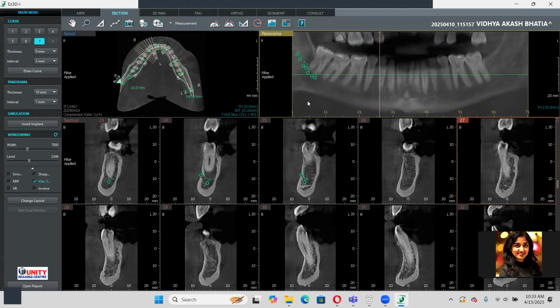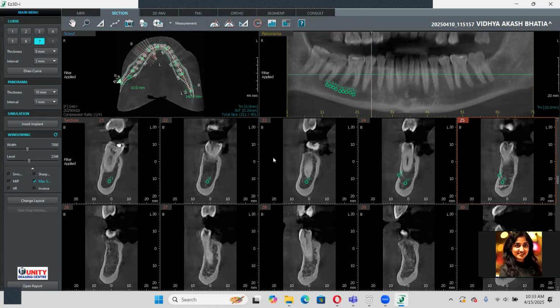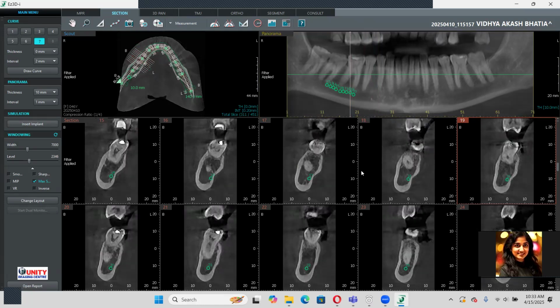Now, since we have put that edit, we can check again. It's not much, but if you feel, you can make a little bit of change, like a little downwards, but it's very minimal, zero point 0.1 mm kind of. But in the slices, it is confirmed that it's within the hole itself. So yes, the canal's course is never straight. So it's fine. A little bit of tortuous course.